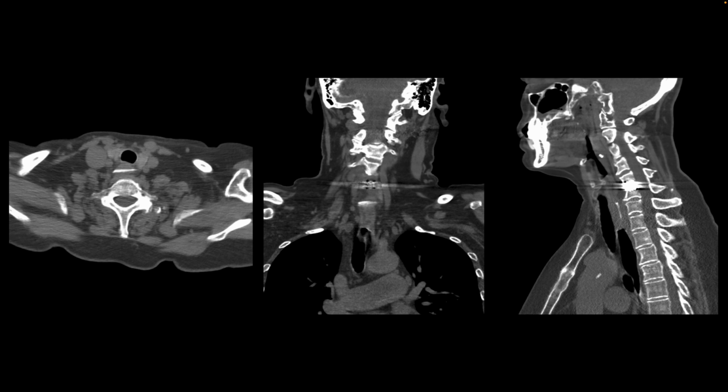This patient presented with acute onset of pain after eating, and so there was a CT performed which shows that in the esophagus, so here is the trachea, left and right lobes of the thyroid, behind it would be the esophagus, and we see this hyperdensity that is horizontally lying in the esophagus, the upper esophagus, also seen here and here in the sagittal images.